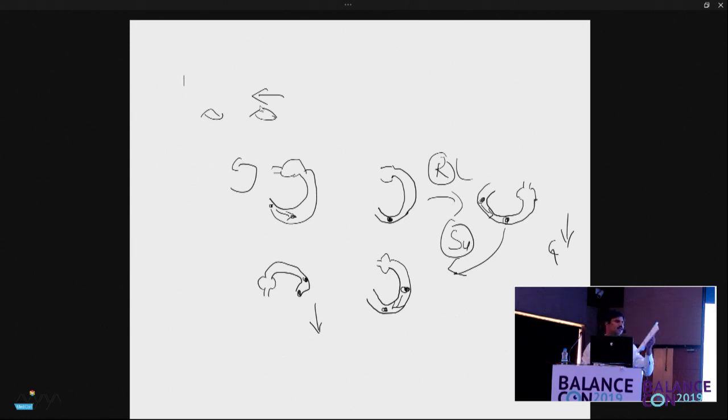Yes. Okay, you are getting a right beating nystagmus. This particular example I chose to show that you can look at the eye and then reach a conclusion as to what exactly is happening in the inner ear. This was about benign paroxysmal positional vertigo.